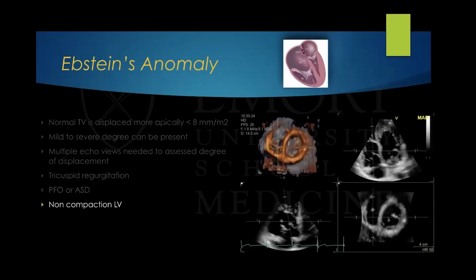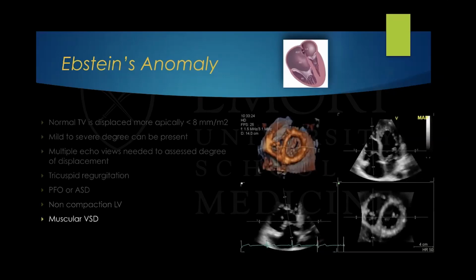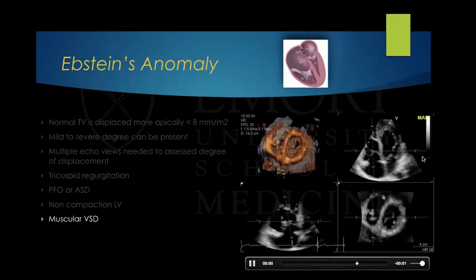Non-compaction LV can be present in this type of condition, and muscular VSD right in the area where the septal leaflet is inserted.